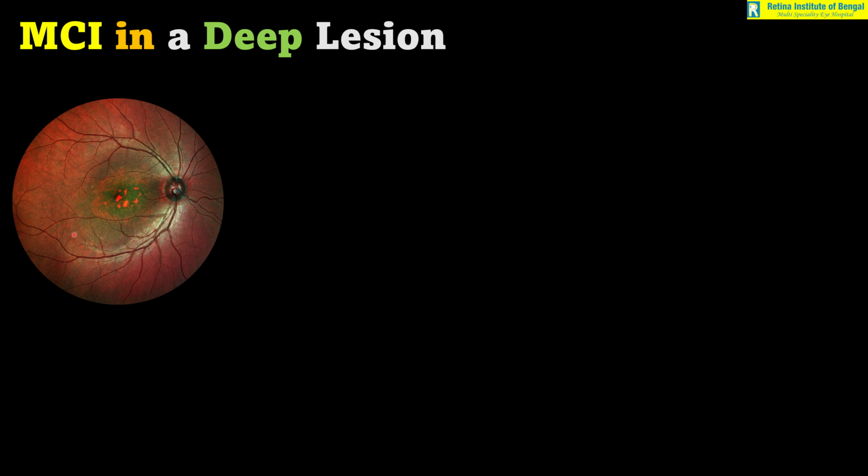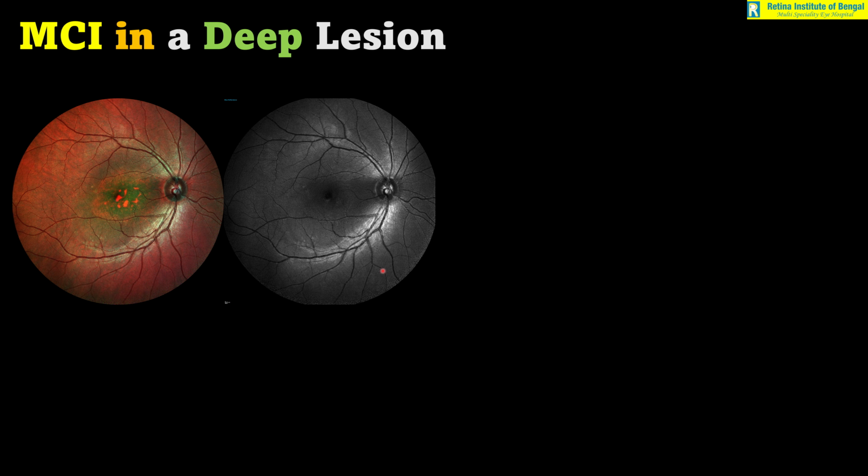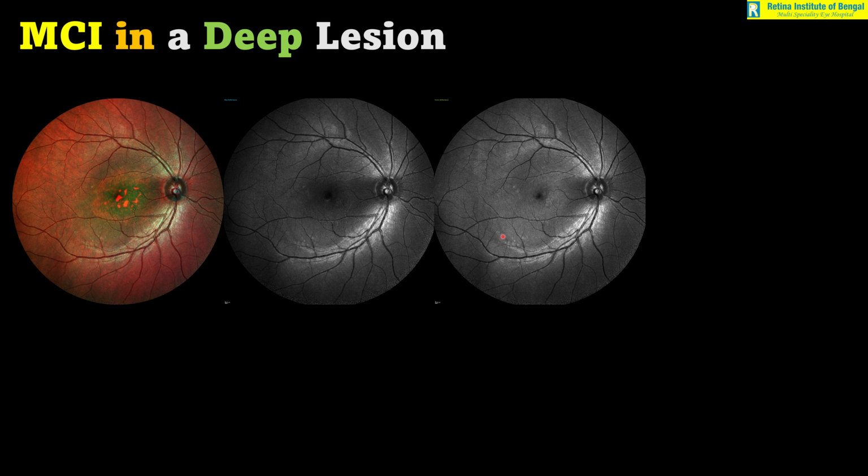Something green means that either the retina is elevated or detached. Now here, if we look at the blue reflectance, again it looks almost absolutely normal. So we know this is not a surface elevation, it is something deeper. In the green, you can now start to make out that there is something, but not really much.